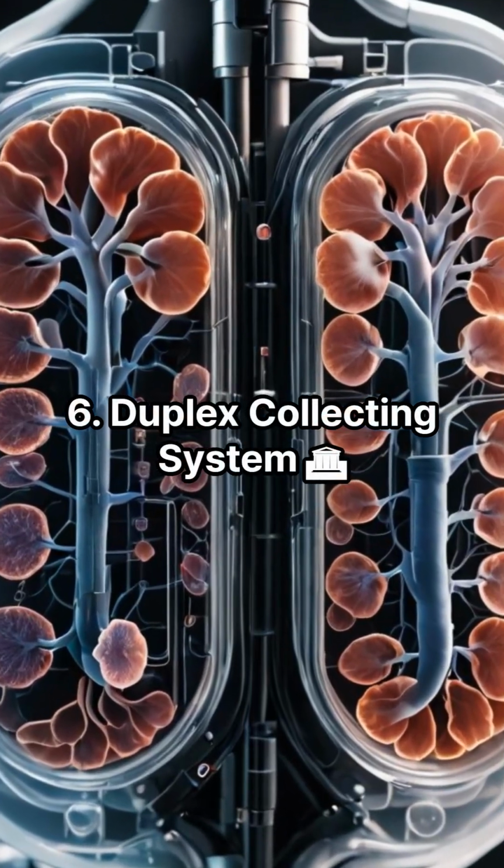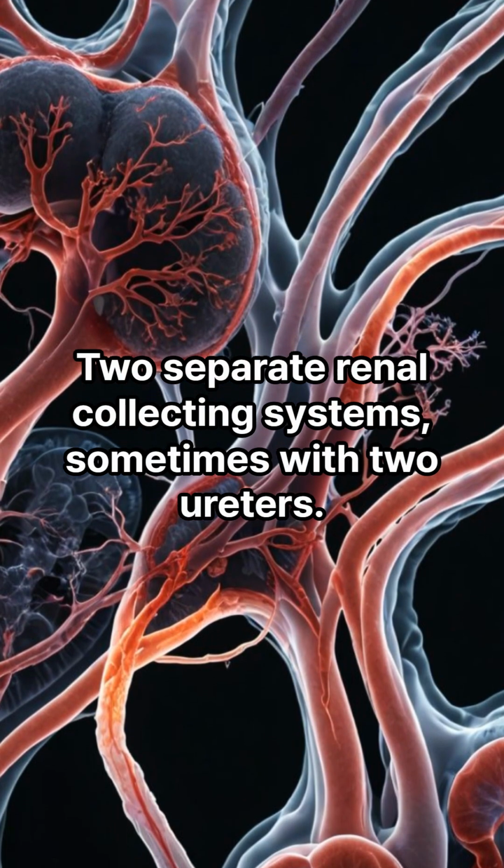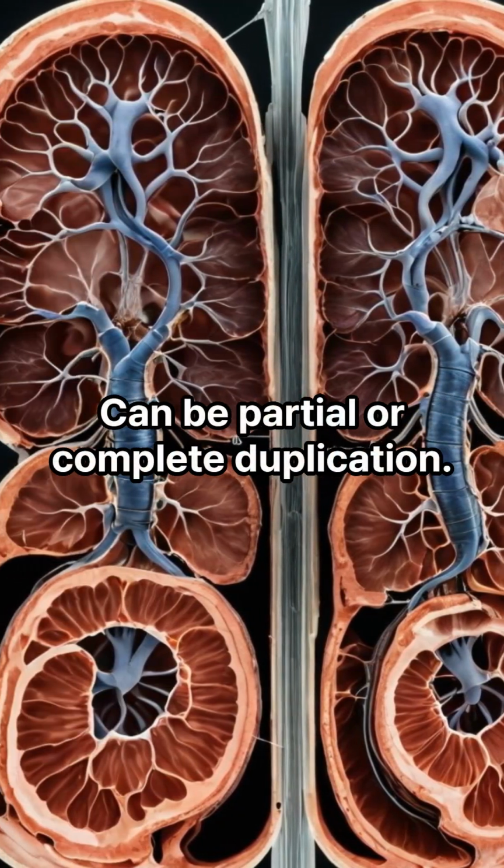6. Duplex collecting system. What is it? Two separate renal collecting systems, sometimes with two ureters. Can be partial or complete duplication.